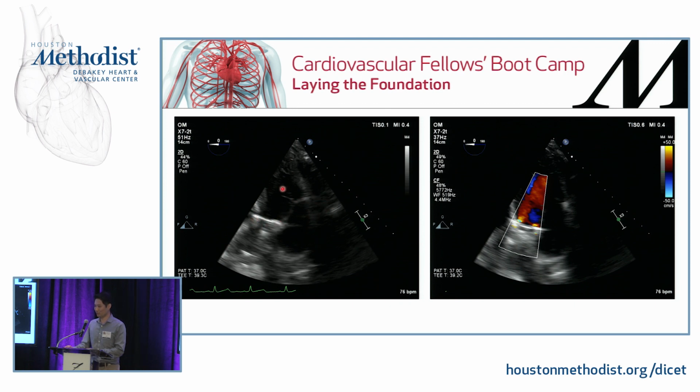And you can see that there's much less shadowing over here, right? Because the sound waves are coming from up here, and they're traveling down over here in a line, right? So that's pretty much how echocardiography works: these are basically scan lines over here, or M mode, and it's a bunch of M modes that are just stitched together. So because of that, you're not getting any shadowing until you hit over here. So you can see all the LV over here.